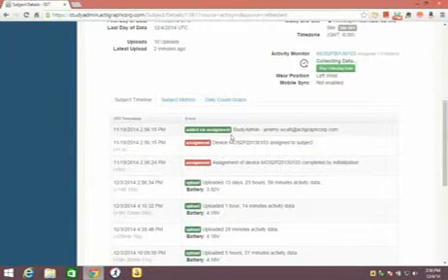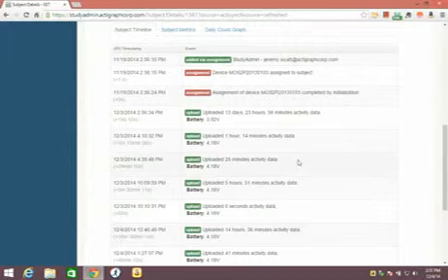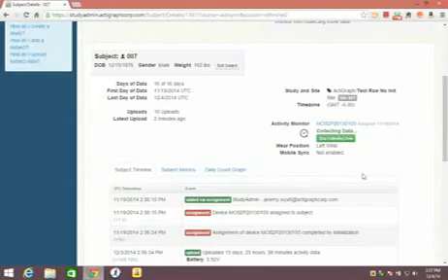One interesting feature in this tool that I'd like to point out is the study timeline, which gives me instant access as a study coordinator to information about my data collection. So I know that on 11/19, this device was assigned using the study admin system by this user, and that is me, of course. And so I've got this history broken down by timestamp, and I know exactly where this device has been at all times. And if I'm using mobile uploads, I'll see the uploads come in through here, and I can audit that myself.